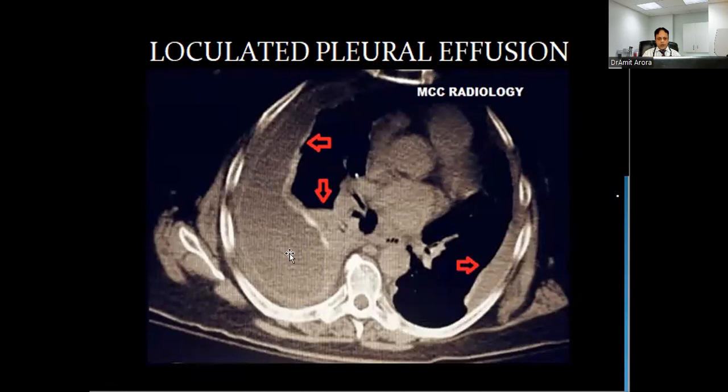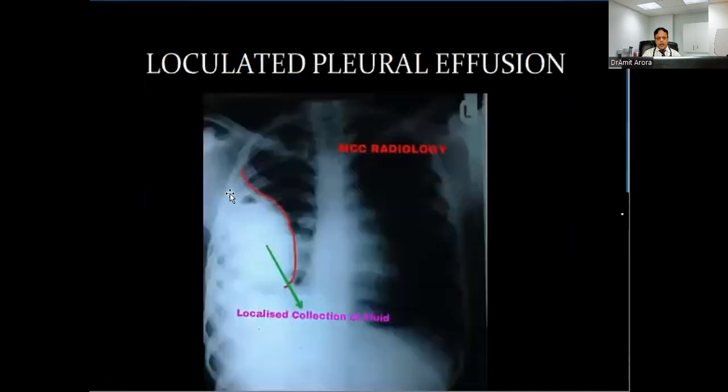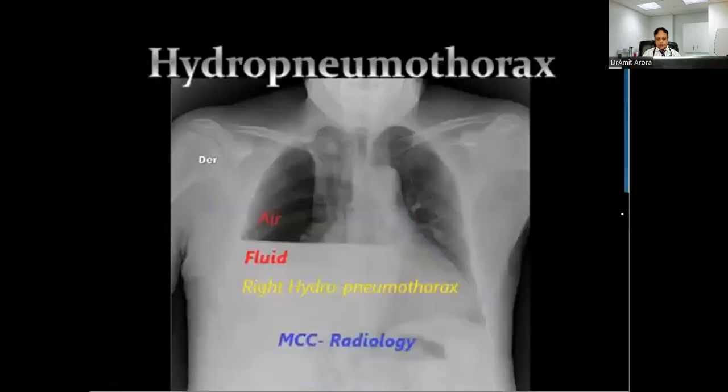You can see this also. We are not going into much detail, but in X-ray you might have seen these kinds of appearances. In the same case, there is a loculated pleural effusion. This is standing, but it is not gravity dependent.